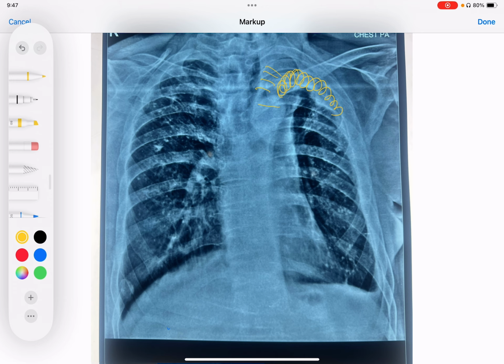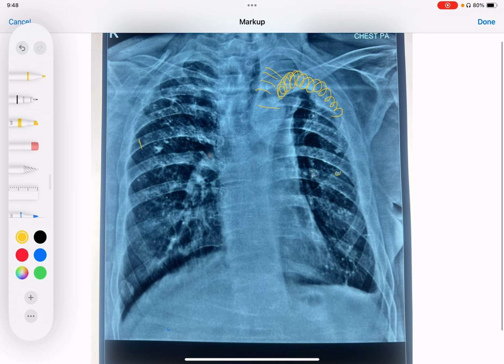So if the patient has bilateral calcifications, you should always think why there was so much extensive infection in the lungs. An immunocompetent patient doesn't usually have this much extensive bilateral calcification. So as there is extensive bilateral lung parenchymal involvement, you may think of an immunosuppressive state.